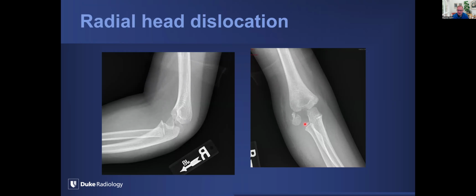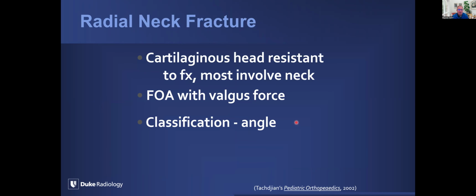This is kind of an interesting one. So this is a capitellar fracture, pretty rare. I don't think I've seen many of these in my career, but we can see that the capitellum here has been fractured and displaced, resulting in an abnormal radiocapitellar line. It took up a chunk of the lateral condyle of the distal humerus with it, and displaced the whole fracture fragment.